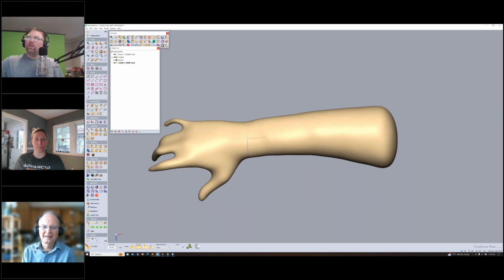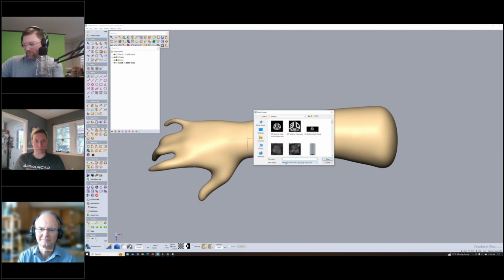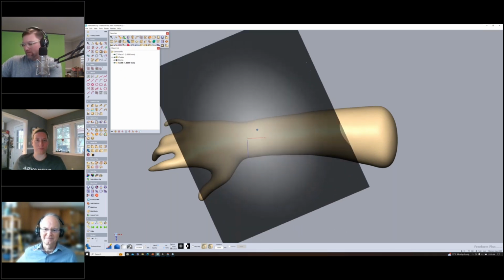And then we know that we want to have some sort of relief. And typically we do a relief over the styloid process here. So we're going to bring in this tool. And I love it. Gregory George is actually the one that taught me this one. It's called the Haze tool. And so it's a gradient map. So you can kind of see the gradients there.